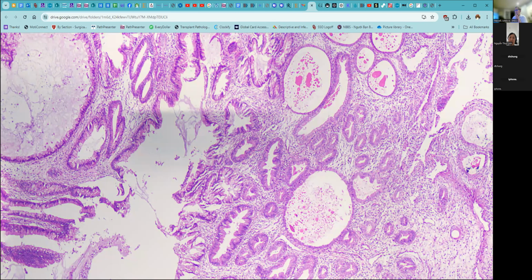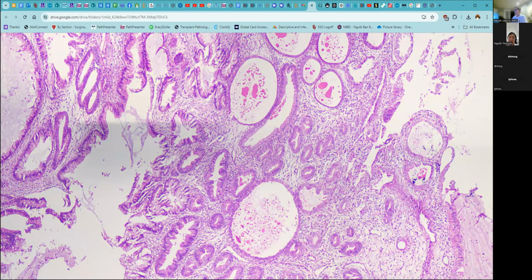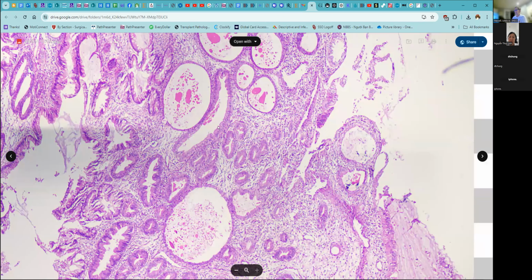So one thing that I notice about this tissue is that the glands are quite orderly. Some are large. Yes, welcome, Dr. Tom. Some are large glands, but many of them have a very bland or non-proliferative appearance. A few are wrinkled and so forth.